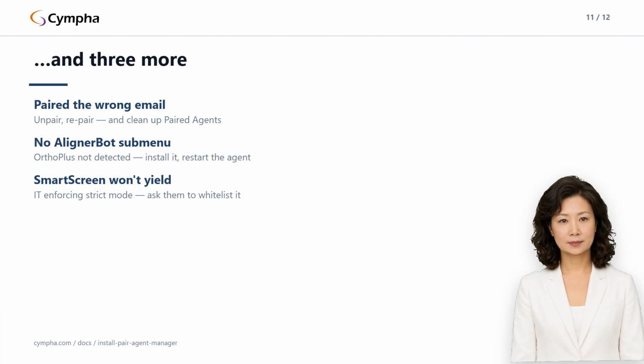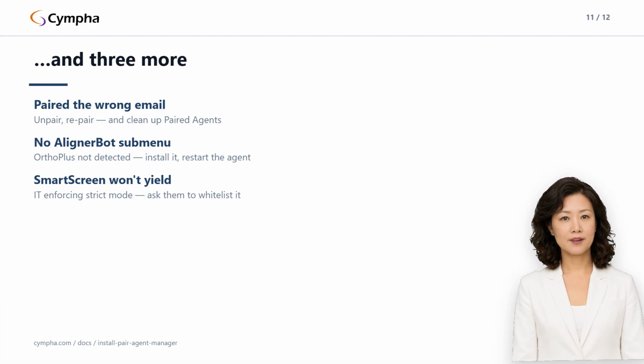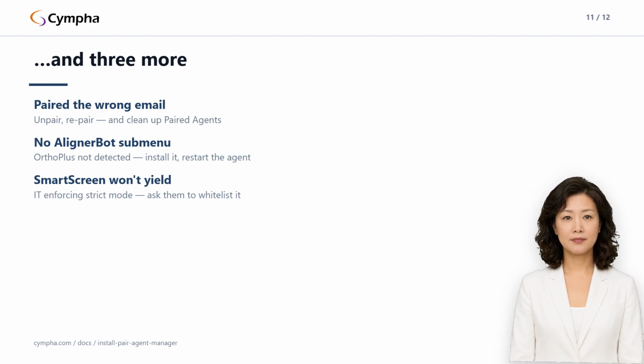If the AlignerBot submenu isn't in the tray menu, nothing is broken. GuideMia OrthoPlus simply isn't detected on this workstation. Install OrthoPlus first, then restart the agent manager, and the submenu appears. And if Windows SmartScreen still blocks the installer even after you've clicked Run anyway, that isn't stubbornness on your part. Your IT department is very likely enforcing SmartScreen in strict mode. They'll need to whitelist the installer or run it for you under an admin account.